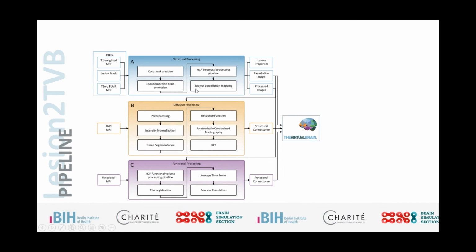So if we want to really have this individual parcellation in subject space, we created a parcellation algorithm here that is based on the surface extracted on the triangulations, and then applies the HCP MMP1, which is the Glasser atlas that is also developed within the Human Connectome Project. It applies this to the individual subject space rather than on volume-based templates, such as, for example, in the MNI space, registering simply to the subject T1, which is significantly less accurate.